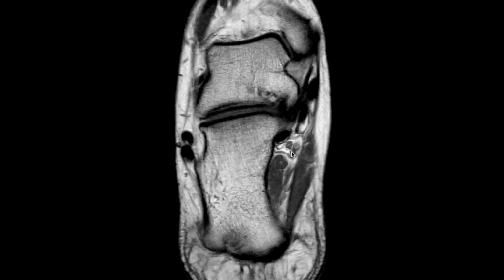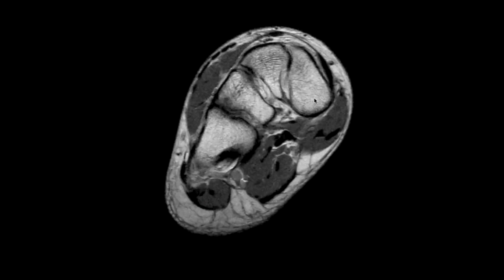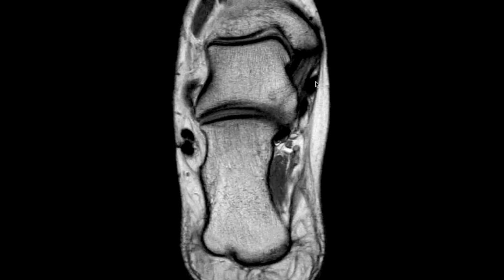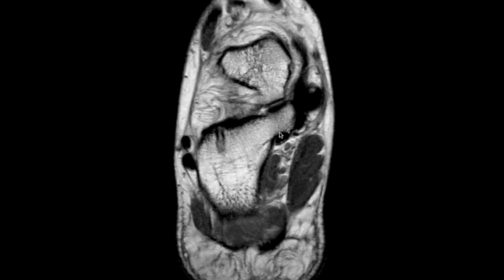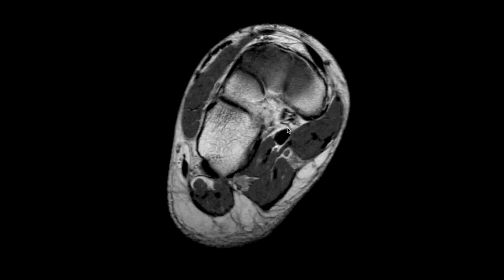Between the intrinsic muscles of the foot, we can follow the plantar neurovascular bundles, so medial and lateral as they travel distally. So here's the medial, and then the lateral plantar neurovascular bundles extending distally. Now, also going from medial to lateral on the posterior-medial aspect, we see the tendons that we already saw on our axial images. So this is the posterior tibial tendon. This is the flexor digitorum longus, and this is the flexor hallucis longus. The flexor hallucis longus will travel along the plantar aspect of the sustentaculum tali. Eventually, the flexor digitorum longus and flexor hallucis longus tendons will cross right here. This is known as the master knot of Henry, which we mentioned previously.